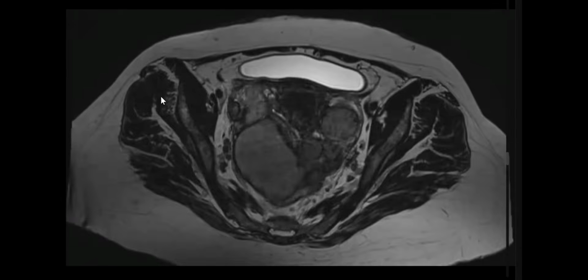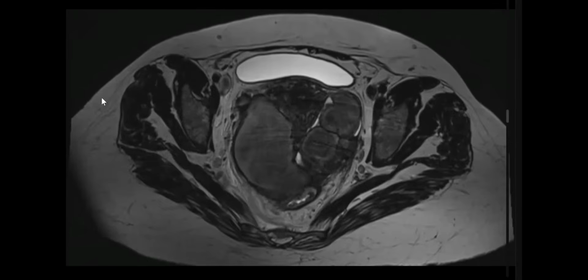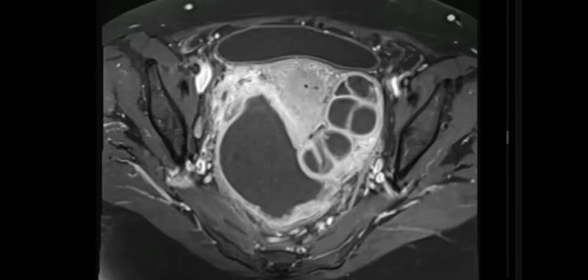I would like to confirm my findings on the diffusion weighted sequence, since I cannot see the organs clearly, and then a contrast study. Yes, I'll give you contrast.